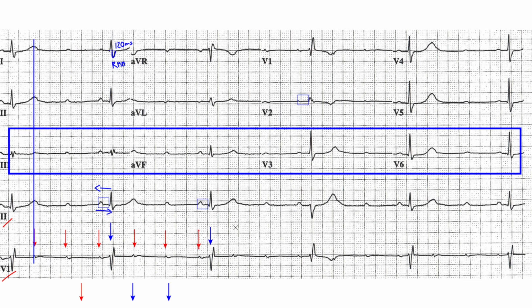So what we have here is a 3-to-1 atrioventricular conduction. Now it seems like that's it, right? No, we're going to keep going.